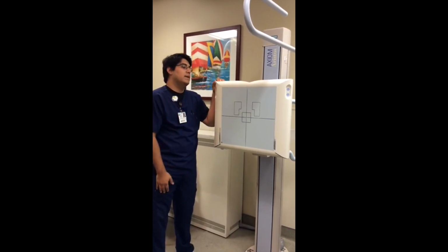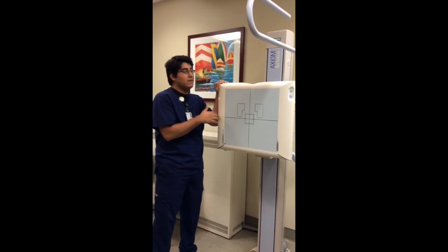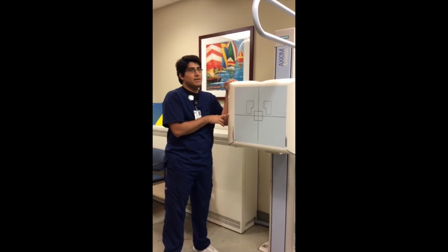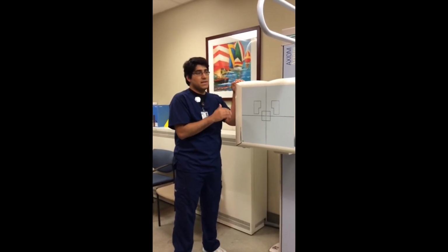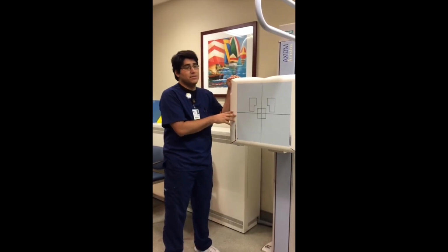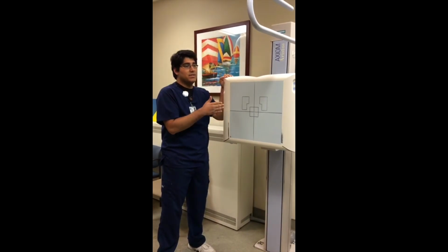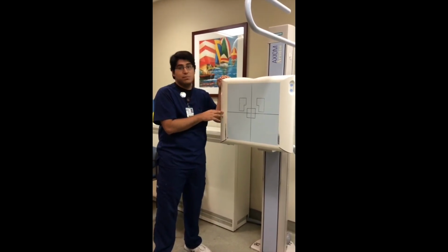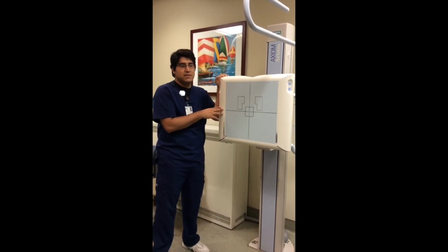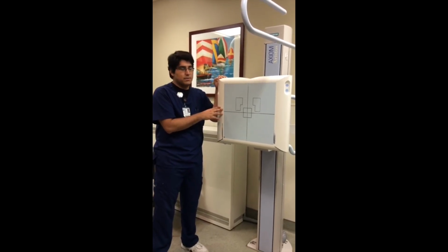It's just built in. And the other one is the backup timer. So the backup timer is set up for the protection of the patient, just in case there's a glitch, there's something going on. It's a backup timer that'll basically shut off the exposure, kind of like maybe you guys have seen in some X-ray rooms. There's an emergency stop button or a stop exposure button or something like that.